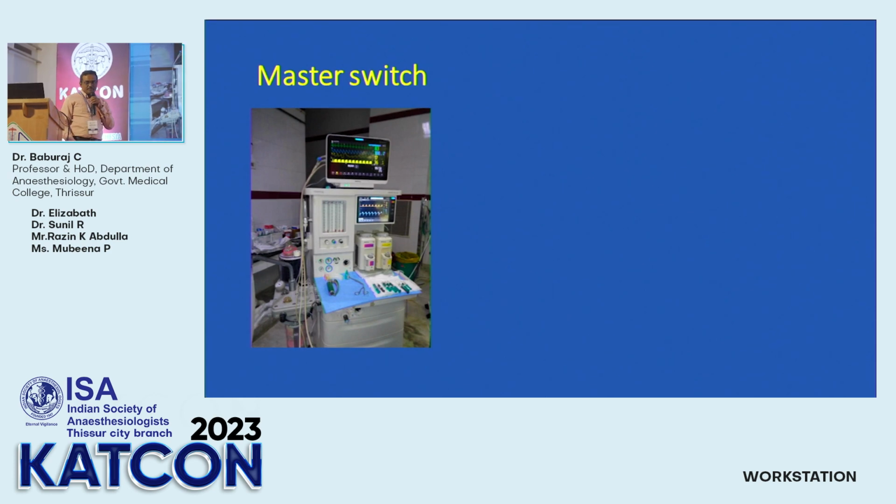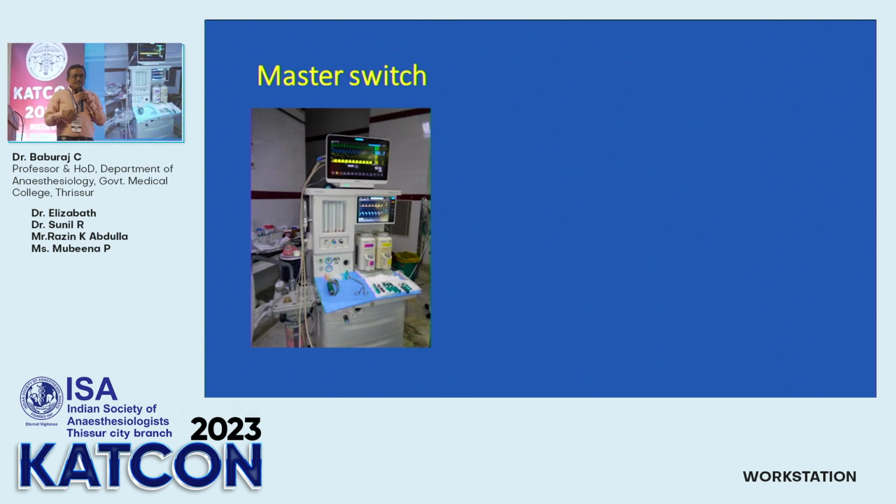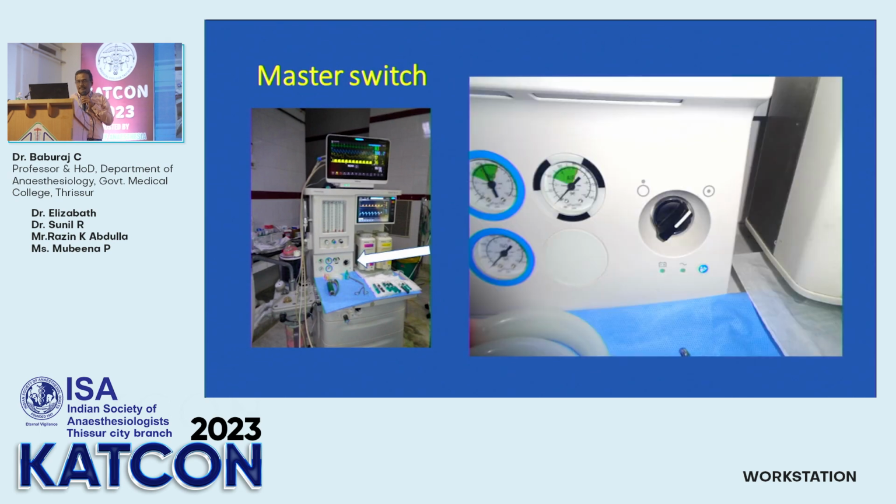Then master switch. Probably the first thing you do after entering the OT is switching on the master switch. It comes with the intermediate pressure system. You can see it. You can see the master switch.